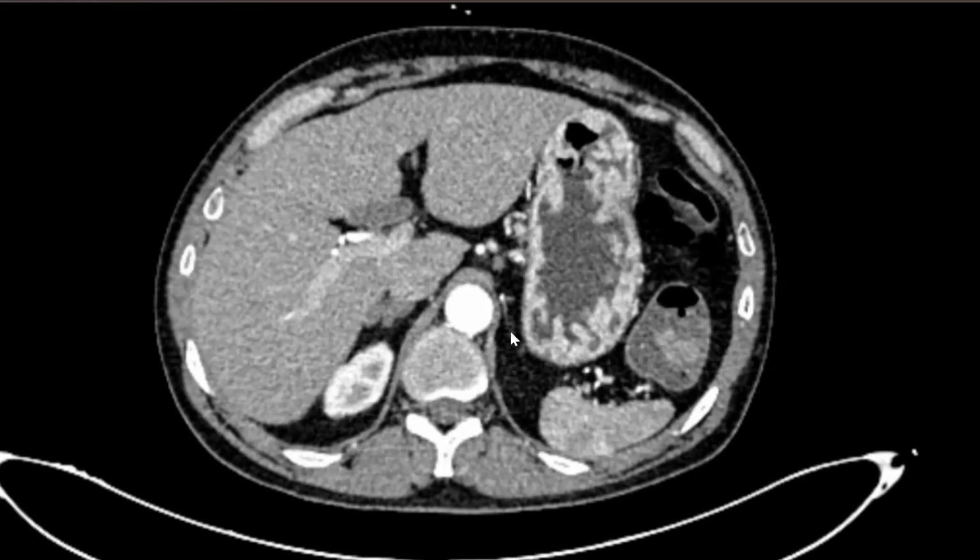Yes. So you were good to mention the part of the MDT. You could have mentioned previous imaging. You mentioned upper GI. But once you could have picked up the finding, then your viva would have been on MEN 1 and that you will look for other associated features. You would have got an MRI sella done to look for any microadenoma, serum prolactin levels, growth hormone levels. And additionally, you could have screened the individuals and all that stuff. Okay.